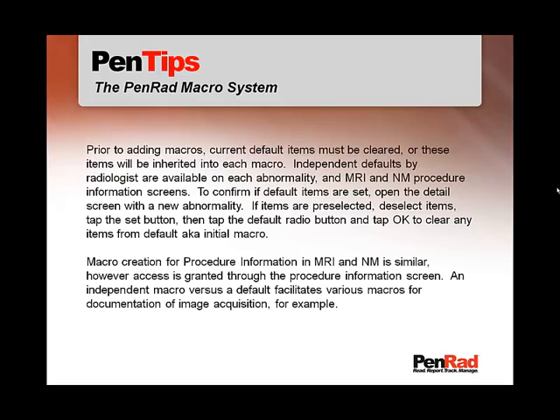Macro creation for procedure information in MRI and nuclear medicine is similar. However, access is granted through the procedure information screen. An independent macro versus a default facilitates various macros for documentation of image acquisition, for example.